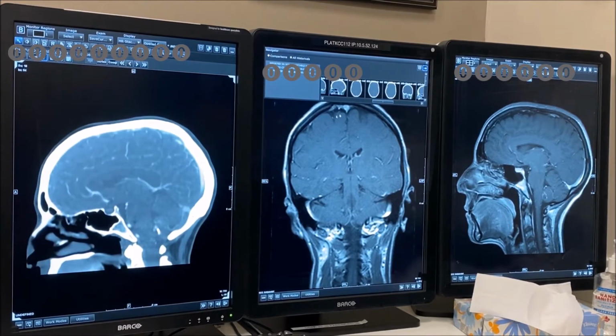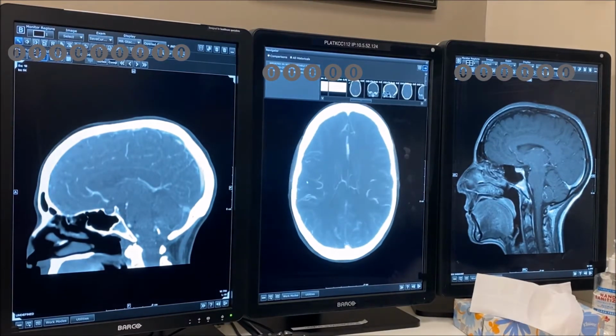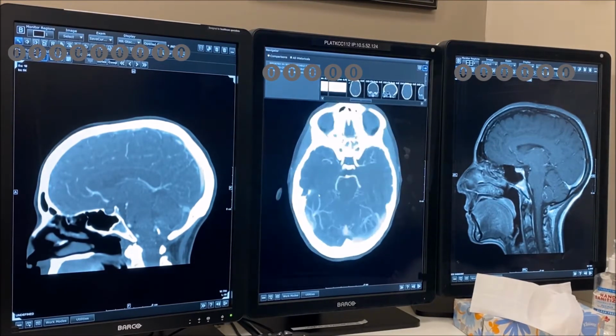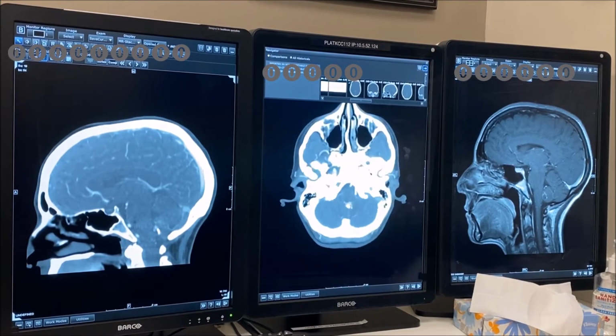Looks like there's some calcification or something. It's important to see the non-contrast. I don't know if there's a non-contrast here. No, it's all contrast. But it does look like calcification that made it highly suggestive. Now you see it just vascular, right? So the guy got an angiogram.